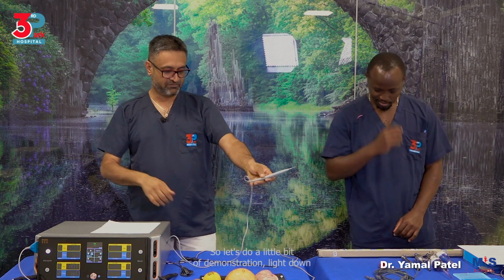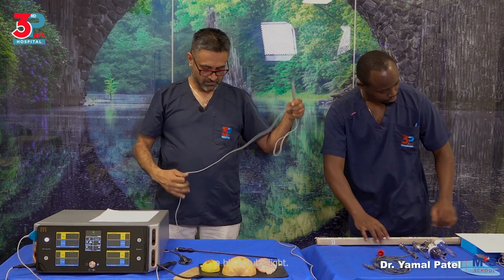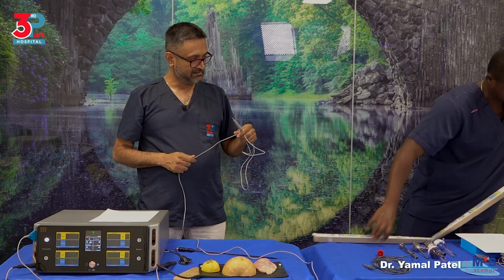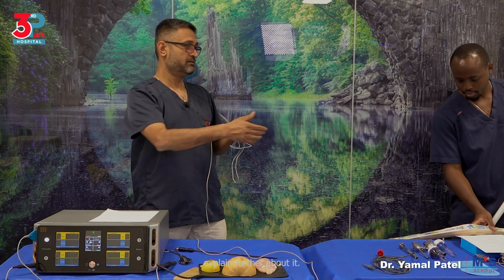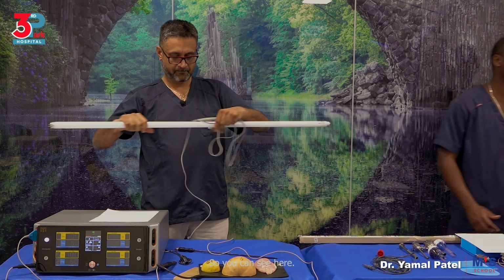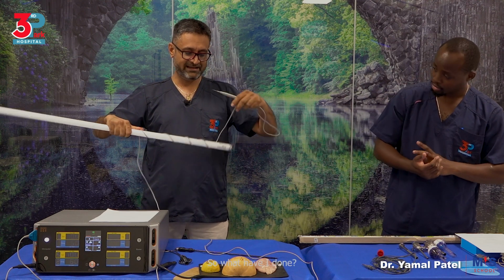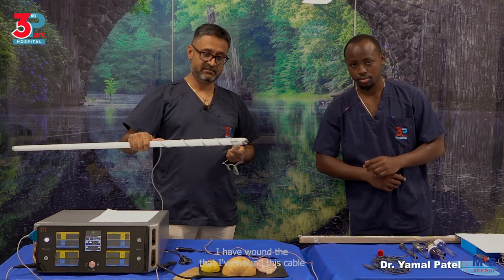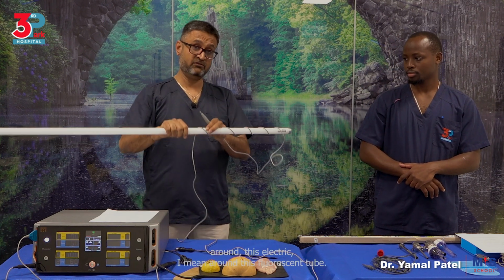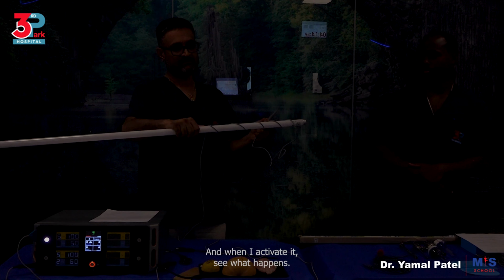So let's do a little bit of demonstration. Light down a bit, tube light. So I want to show you something as we then explain further about it. So you can see here, so what have I done? I have wound this cable around this fluorescent tube. And when I activate it, see what happens.